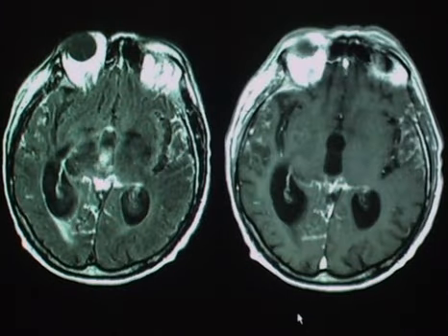Another yet more conspicuous example, and what we see is, again, the FLAIR imaging and the post-contrast imaging demonstrating the abnormal enhancement within multiple cerebral sulci. But here we've also got abnormal signal seen around the right lateral ventricular trigone and some abnormal signal along the ependyma, compatible with ongoing ventriculitis. And in the same patient with meningitis, we've got some ventricular enlargement as manifested by increased width of the third ventricle and the lateral ventricles compatible with an associated hydrocephalus.